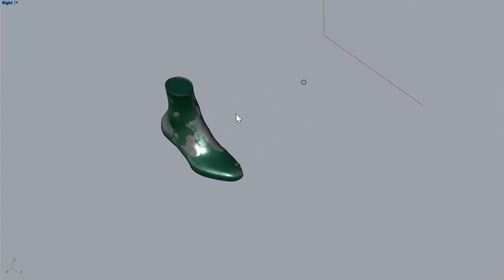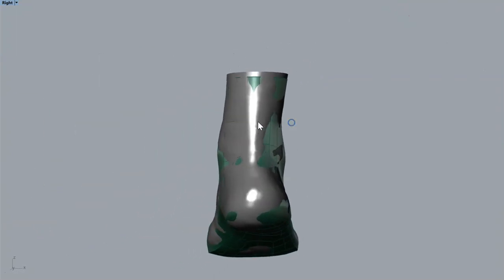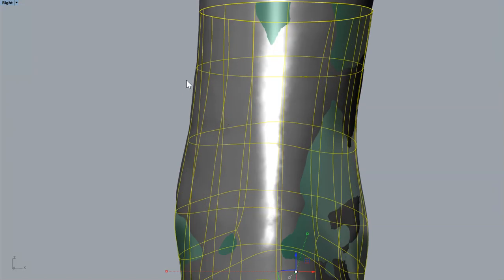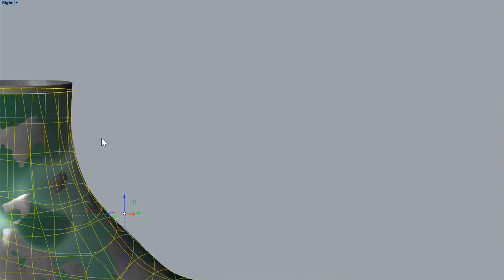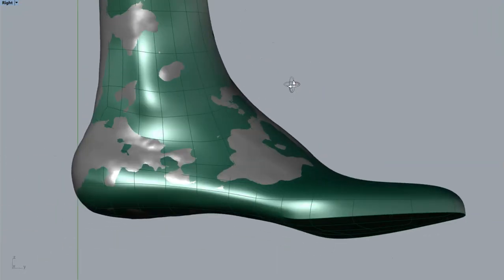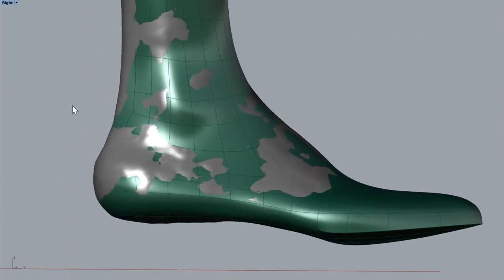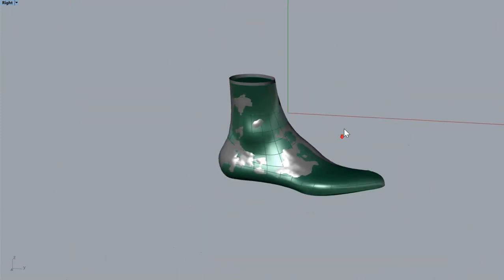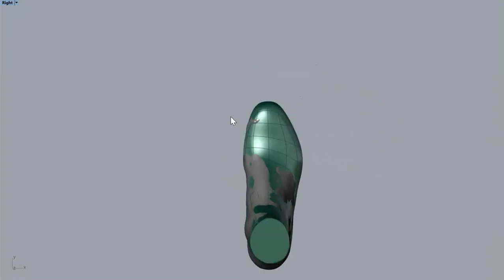So now it's on the same location as my scan, so you can see all the differences. You see, it's a bit smaller. It's like it has the same effect as when you smoothen the surface of a real last. You lose a bit of material. There's some extra space around the ankles. There's extra room for the toes.